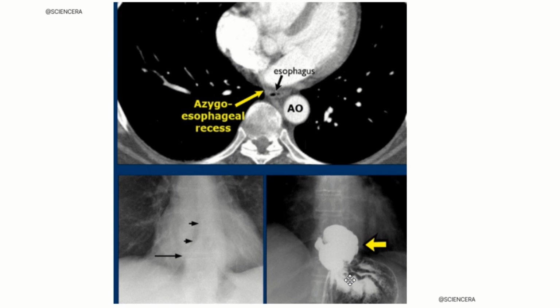Then you might get esophageal disease. A condition affecting the esophagus, like inflammation or a tumor, can cause changes in nearby structures and their position. So your azygoesophageal recess will indicate that there is a problem, as the structures are not in their usual place if there is an esophageal disease. Then another reason is left atrial enlargement. When the left atrium of the heart becomes enlarged, it can push against nearby structures, including your esophagus, which might alter the azygoesophageal line.